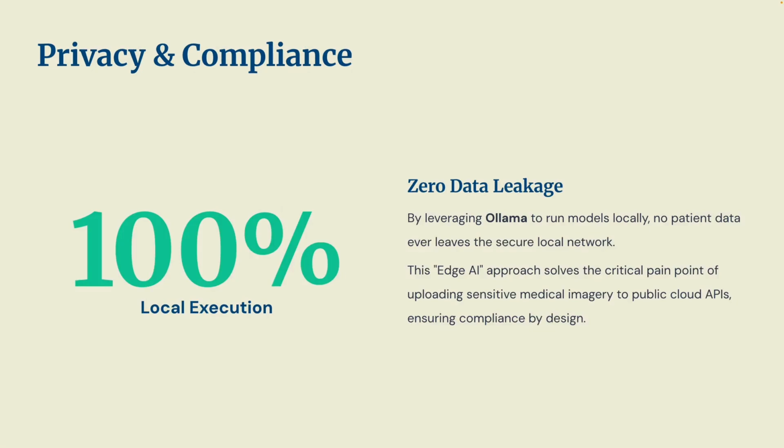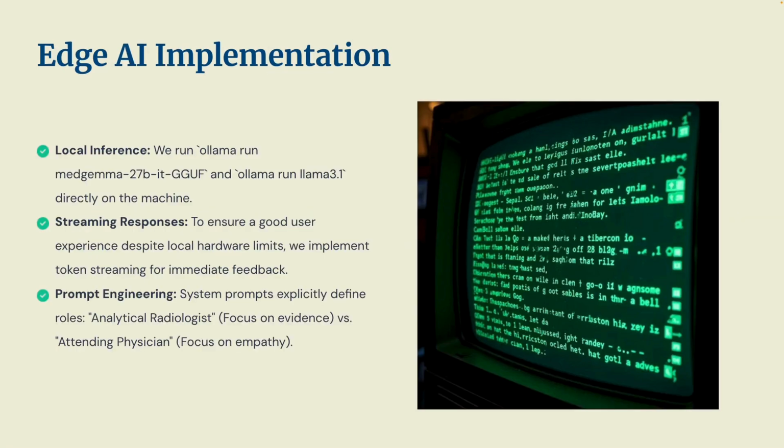Now I want to emphasize the most critical aspect of this project. It's privacy and compliance. Medical data is highly sensitive. Uploading patient X-rays to a public cloud API poses a massive risk of data leakage and violations. We solve this pain point by running everything locally using Ollama. So both MedGemma and Llama 3 run entirely on the local machine.